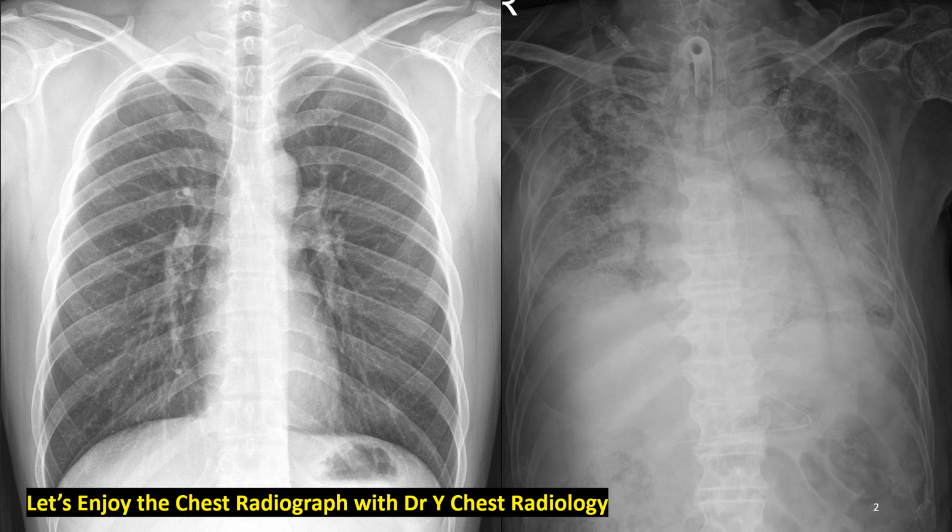Let's start this session with these two films. How do you feel with this left side film? This is a chest PA erect film. Normal, healthy young man without unusual, abnormal findings. Feel comfortable, something like a nice picture. But how about this right side film?